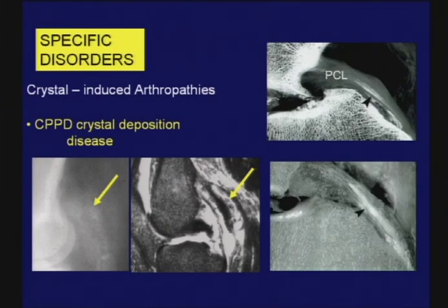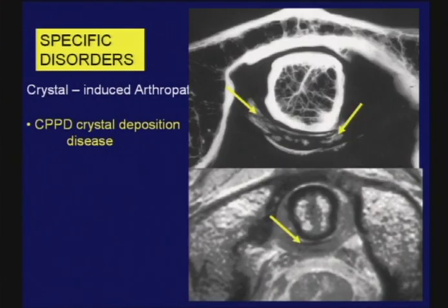So we see examples like this where we get calcification in tendons, and the gastroc tendons in particular. On the MR image, it really is bizarre. You wouldn't know exactly what's going on. And we see examples, not infrequently, where the cruciate ligaments have calcium in them, as shown here. So be aware that if you're dealing with calcium pyrophosphate disease, widespread calcium deposits are expected.